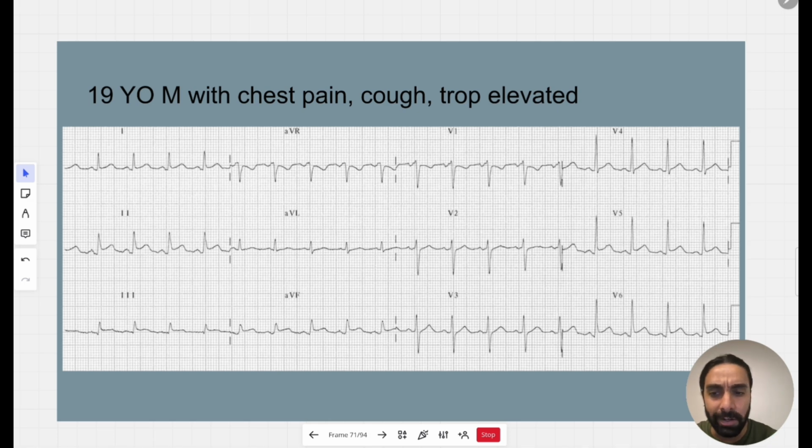So this patient is tachycardic. We don't have a 10-second strip, but if you follow these, it looks pretty regular. And there is a positive P wave in lead 2. But you do see these ST elevations, it looks like in lead 2, in lead 1. You see some in V4, V5, V6. You see some STE, looks like depression maybe in V1. But overall, you see widespread ST elevations, and you don't typically see reciprocal ST depressions in these patients.